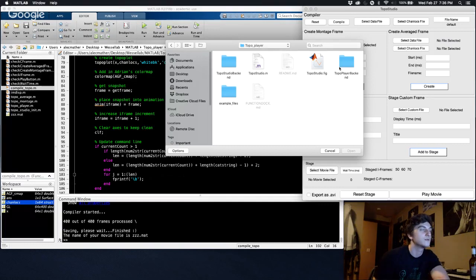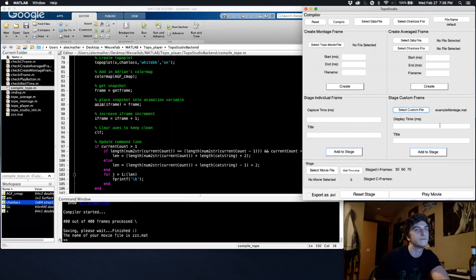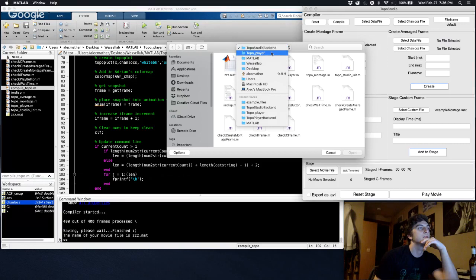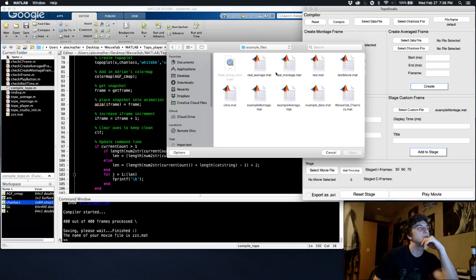We can do the average too, but I already made example montage. I already made them both. Actually, I think I made a new one that was better than that. I think it's real montage.